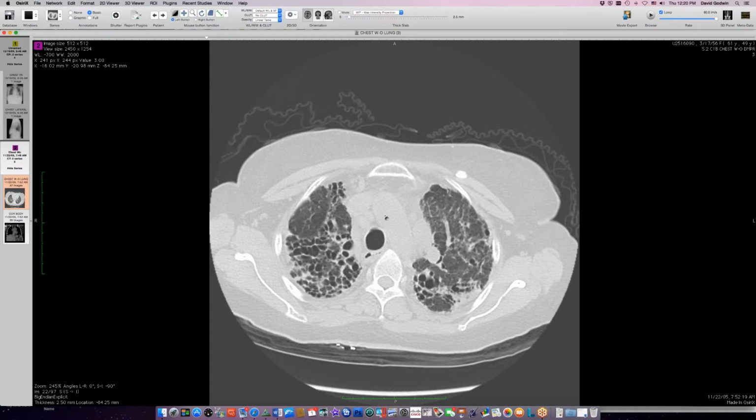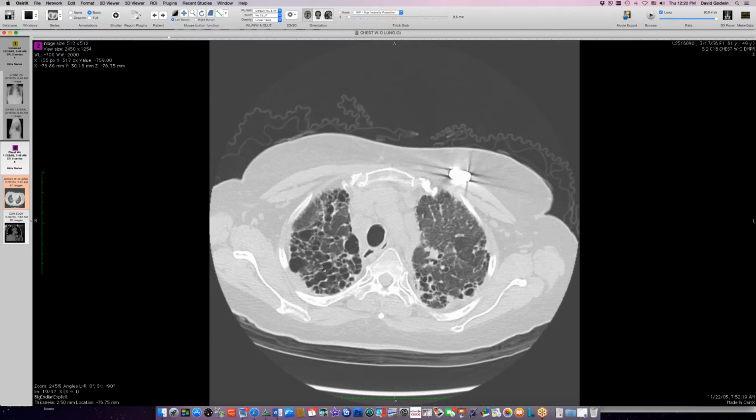So this honeycomb-like pattern that's not really honeycombing, in terms of having thick, fibrotic walls and a reticular pattern around the holes in the lung. I'm still going to look for that sarcoid case that's more dramatic than this, in terms of having an abundance of thin-walled cysts that lined the fissures and so forth, but predominated in upper lungs, that has that bubbly look of the first case. So Rod was thinking also that there was a component of emphysema with this when we talked, with the first case that had path.